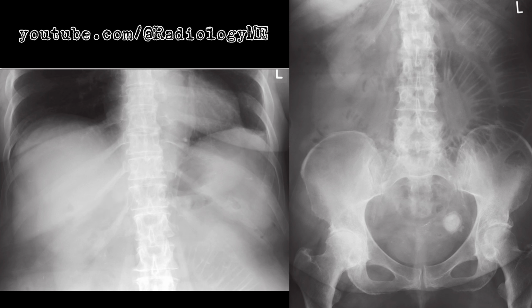The absence of perforation here doesn't diminish the severity of the situation, as gallstone ileus often requires surgical intervention to relieve the obstruction. What else could this be? In terms of differential diagnoses, I'd consider other causes of bowel obstruction. A large obstructing tumor could present similarly with dilated loops of bowel, but the presence of a calcified opacity shifts my thinking away from that.